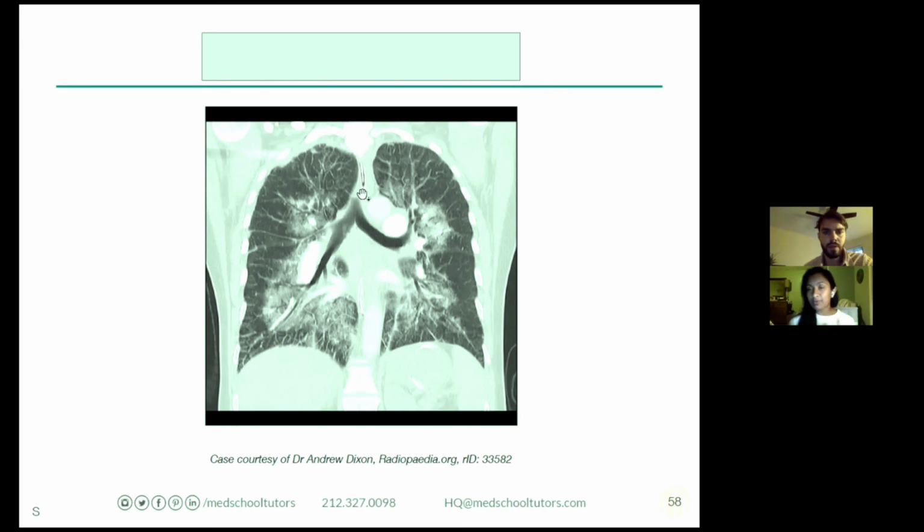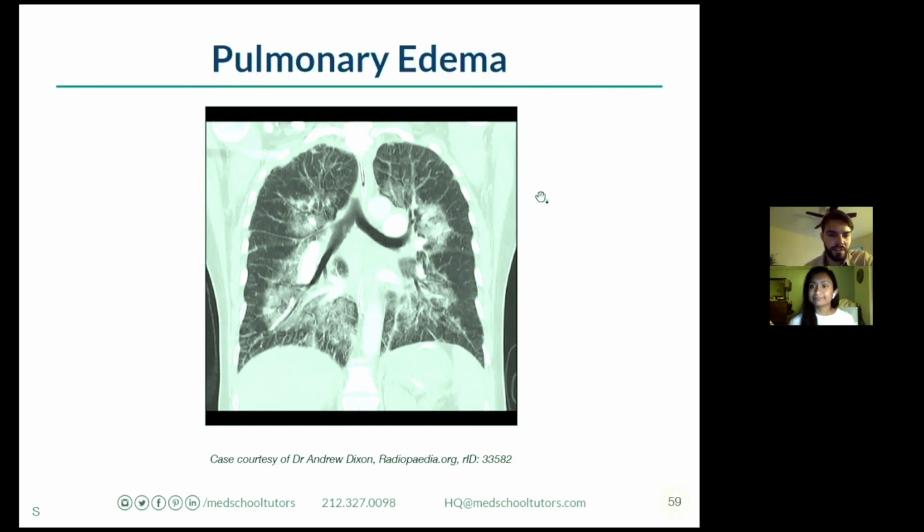So this patient would probably have some sort of heart failure history to further support that. But this is why you get that X-ray image. Remember that X-ray where the periphery looked kind of okay, but the center was all hazy and white? That is because this is the underlying CT for that same pathology. Awesome. Thank you. So pulmonary edema. The perfect segue there.